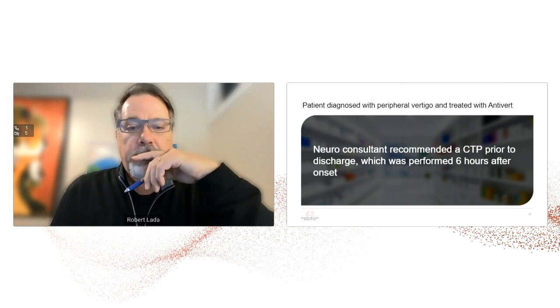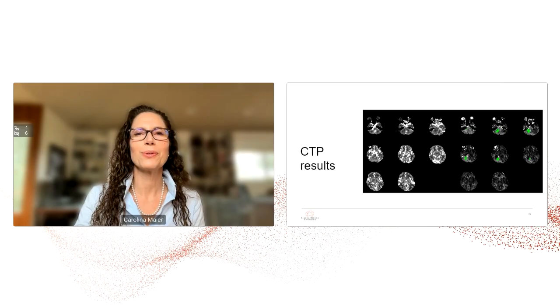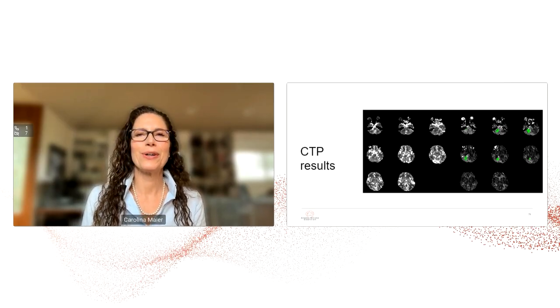Fantastic. Thank you so much. So let's actually see what happened next here. So let's look at the CTP results here. So here we are. What is the diagnosis here? And should this patient receive thrombolysis? Let's go to Dr. Albers.